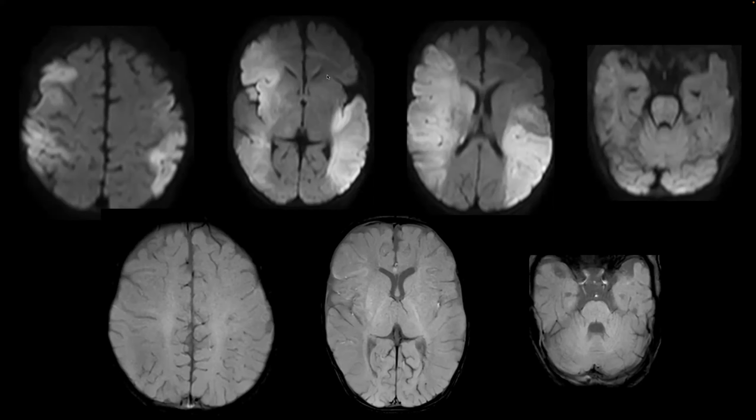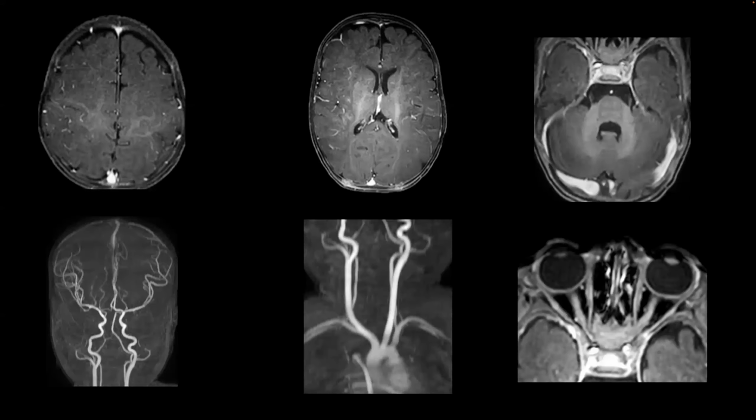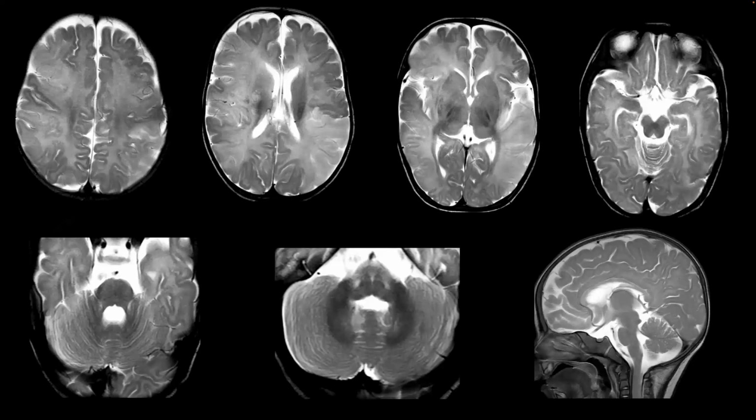All right. Let's hope for the child. Is there any old gliosis? Just one thing, because the radiologist felt there was an old gliosis. No, I can't find an old gliosis. There's no focal volume loss for that. The sulci, even the deep nuclei, the volume is well preserved and symmetrical, so I cannot appreciate any gliosis.